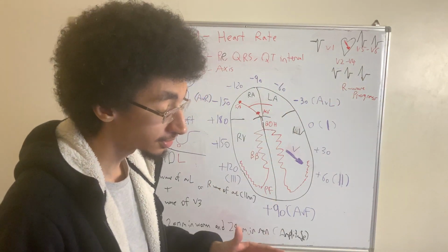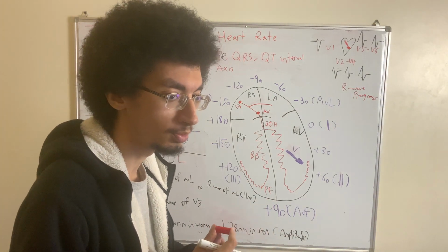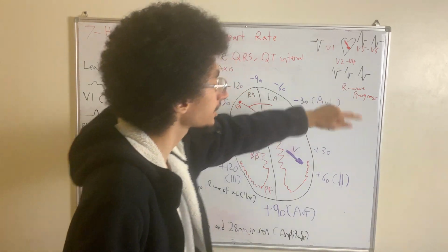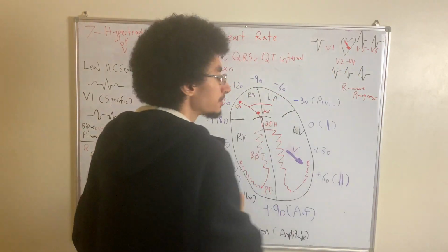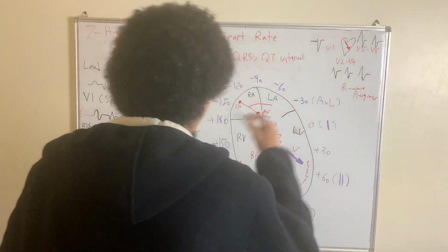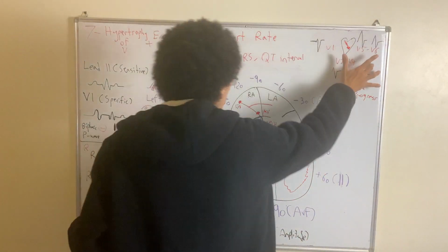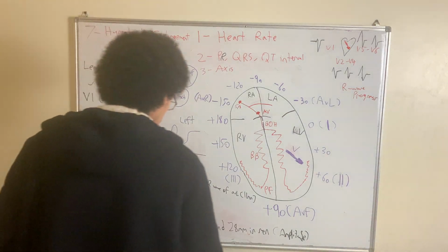Mumtaz? This is very important to know for this video and upcoming videos, because this R wave progression is normal. But in some cases, this can be affected. You might see the opposite, the R wave being smaller than the S wave, and we'll see an example of it in this video. Okay? So that's a quick little explanation about the cardiac axis of the precordial leads, similar to the cardiac axis revolving around the limb leads. Okay? Let's give it a check.